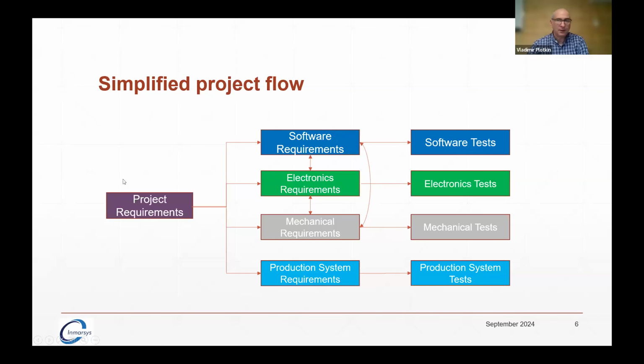I'm not going to deep dive into those because that is done by the systems team. So it's generated outside of the software process. Someone else in the systems team and the company management decided that's what we're going to build. And these project level requirements include lots of stuff, which is not just software, but also the electronics, mechanics, packaging, regulatory, shipment, export requirements, and so on. I'll show you how it's organized in Spira.